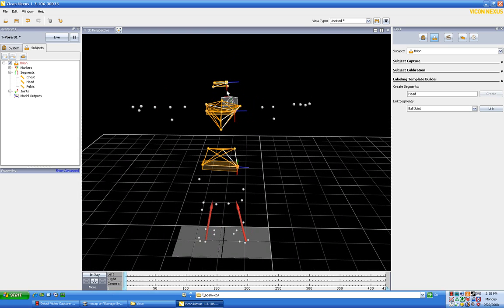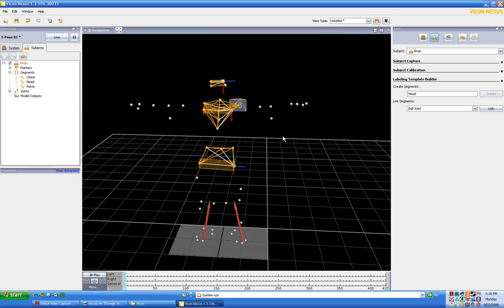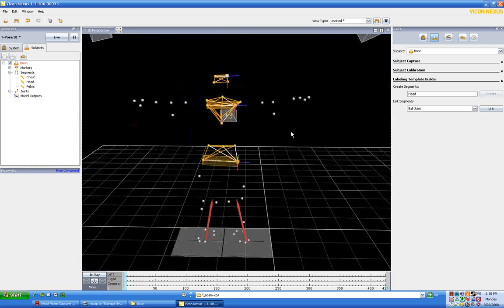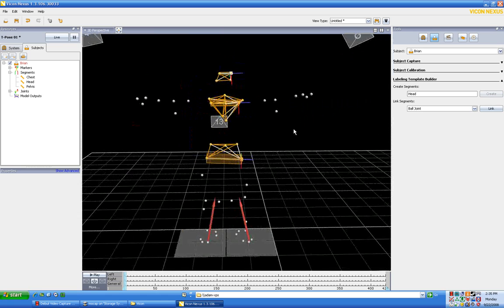And if you look here, you're going to see these orienter things where they're defining the X, Y, and Z planes. This is going to be important later. Just notice them for right now.